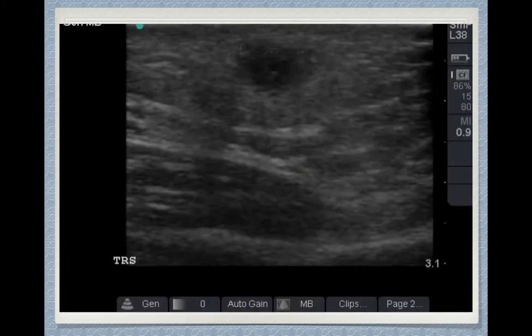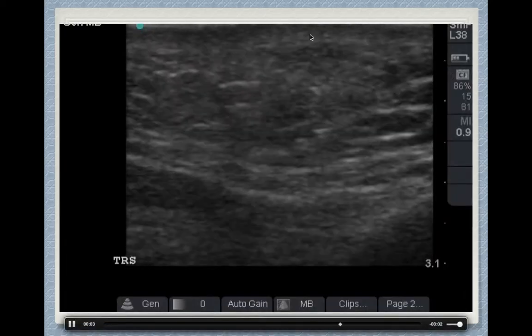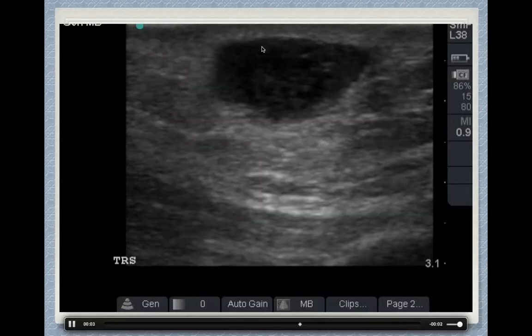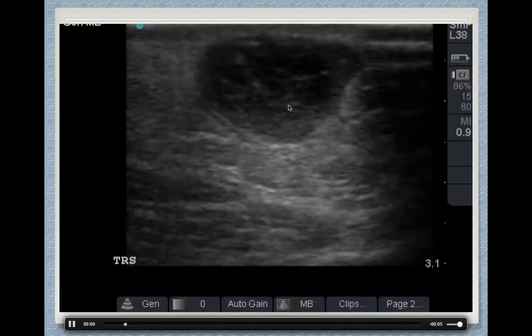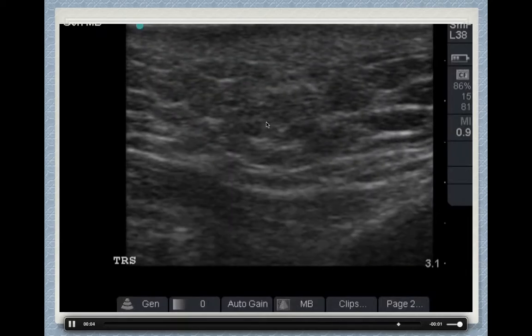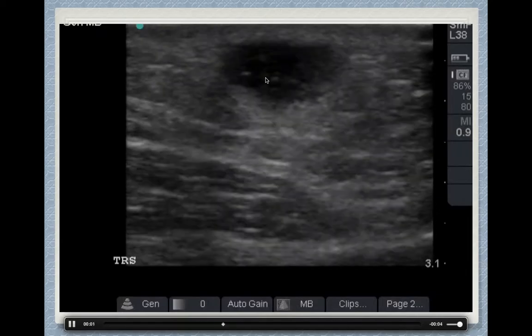Next, go on to abscess. So first off, when we think of an abscess, we think of a fluid collection that's dark, correct? So an anechoic fluid collection. Part of this quick talk will be to take you away from that and to broaden your idea of what an abscess can be. But the simple abscess that we see all the time looks like this.